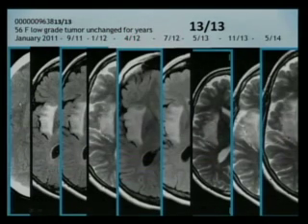It's a hypodensity on the CT scan. That was in January of 11. In September, she had an MRI scan which showed the same thing, but a lot more striking because this is a FLAIR sequence.